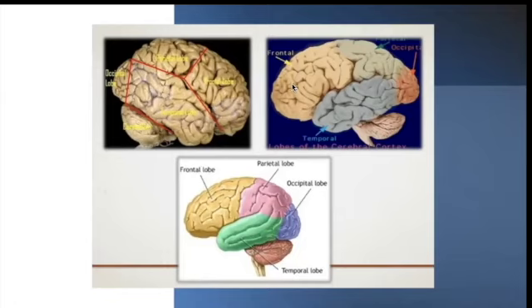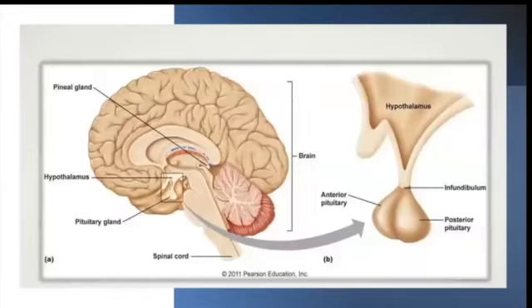So please, I just want you to keep your attention mainly for the central sulcus and the lateral sulcus. So this is the central sulcus, and it's well depicted here. It serves to separate the frontal lobe from the parietal lobe. And here we have the lateral sulcus, which serves to separate the temporal lobe from the parietal and frontal lobes. So these are your most important landmarks, the central and the lateral sulci, okay? And most posteriorly, as we previously said, we have the occipital lobe. So let's proceed from here.